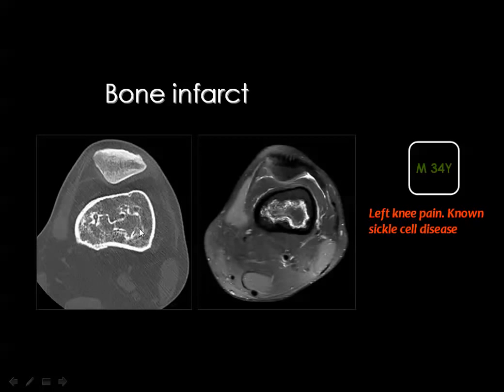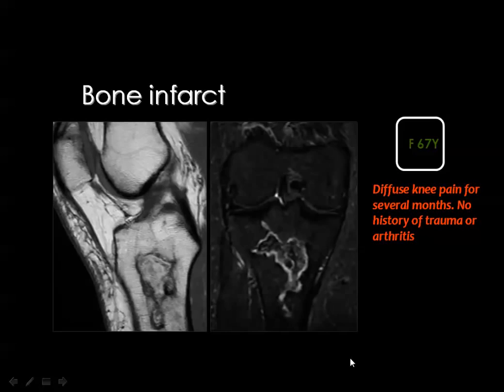You see a sclerotic lesion within the medulla, and this is by MRI, the typical appearance by MRI. And this is also an example of the typical appearance of bone infarction within the medulla of the proximal tibia with the lines I have mentioned.